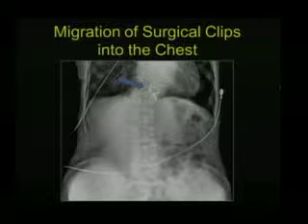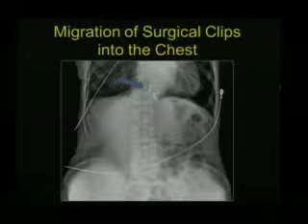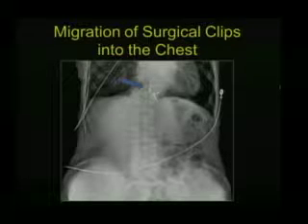Okay, so in some cases, when you read the plain chest films or the plain abdominal films, and you know in advance that the patient had a gastric fundoplication, and you see the metallic clips above the diaphragm, you can suspect that there is a failed fundoplication. It's not 100% sure, because in some cases the surgeon on purpose leaves the fundoplication in the chest, but they are very rare cases.